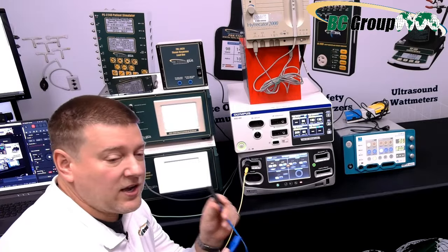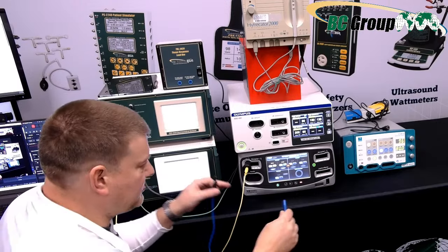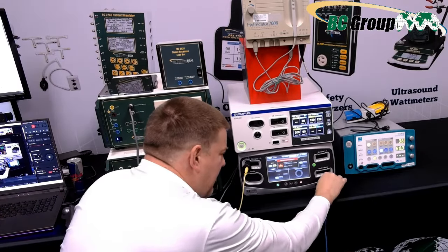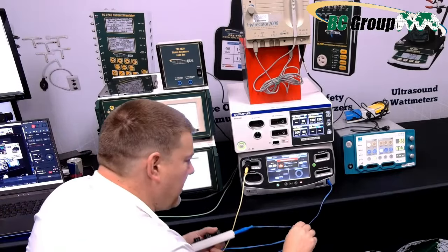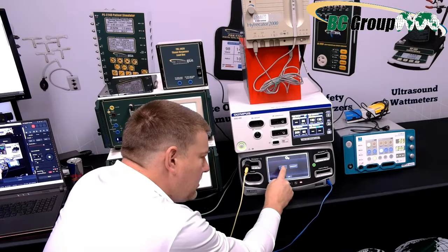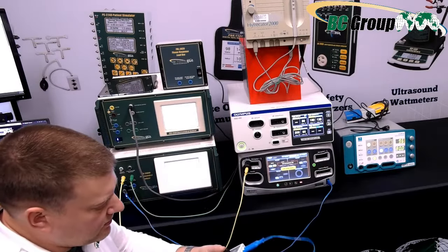Anyway, we're not going to attenuate the signal going through any resistors or anything. You want it as direct as possible. So let's go ahead and connect that guy back up there. It is definitely not happy, and that is because we have to put this guy in demo mode. Okay, that should stop those alarms for the time being.